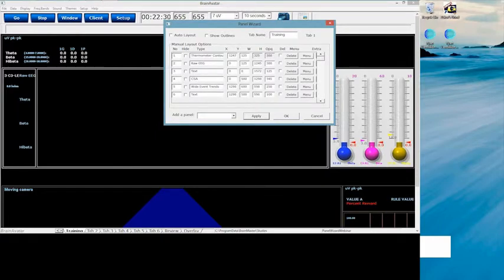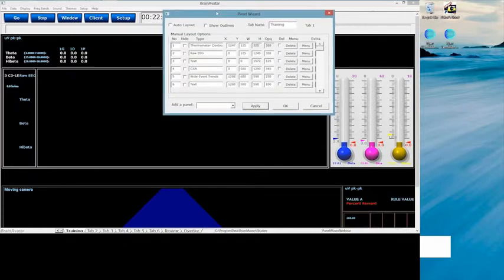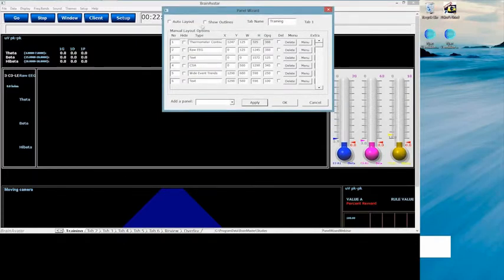Now, of course, if I wanted to show more information, I can do so. And I'm going to play around with that here in a little bit. We're going to play with all the different panels and display different information and make this even more customizable for us. But right now, let's start shrinking some more things in. So I'm going to go with my CSA display right down here.